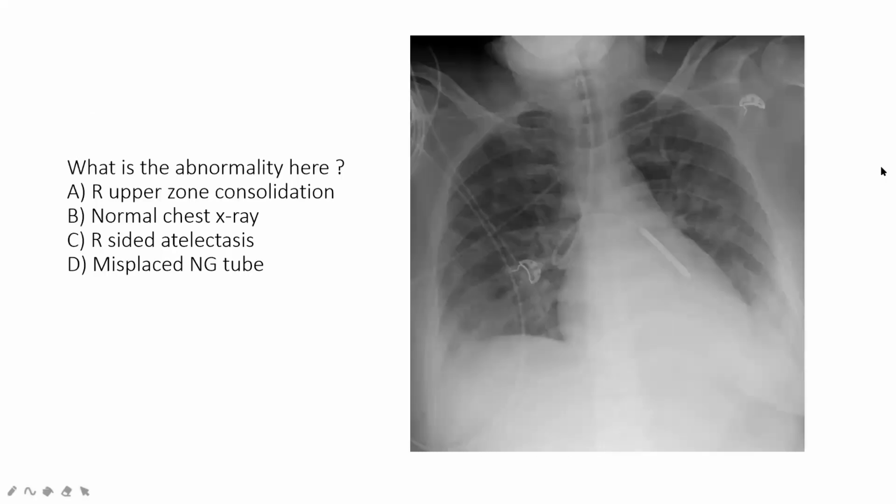Okay, so this is case number 3. Can anyone tell me what the abnormality here is? Okay, so yeah, I'll give you another 5 to 10 seconds.